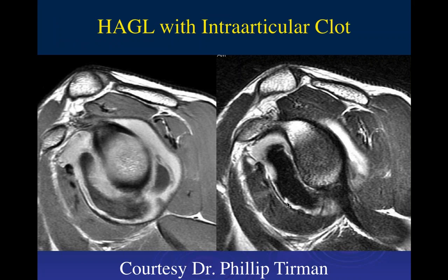and there's blood product. Clot, I guess. Yeah. Okay. Huh. Blood is not supposed to clot in joint spaces because typically the fluid in the joint space will dilute the clotting factors such that you don't get a clot. But this turned out to be a rare clot within the joint space due to an acute hemorrhage. Well, there's a tear someplace.